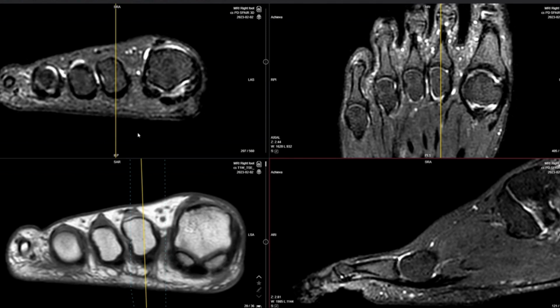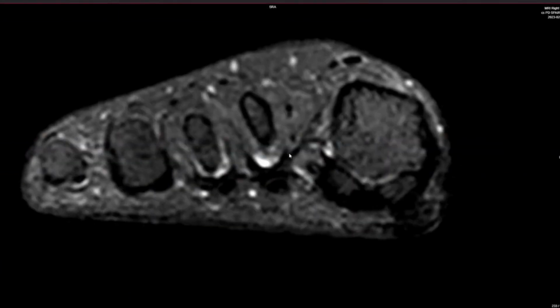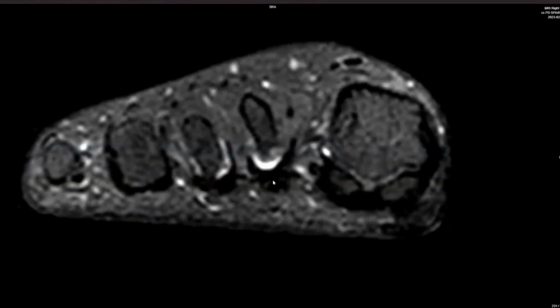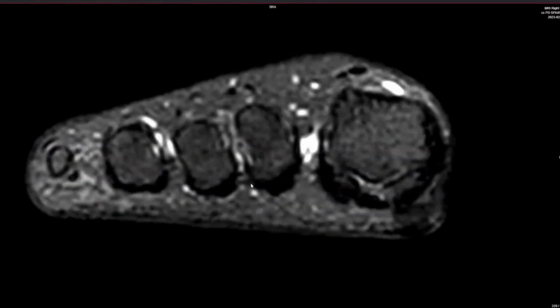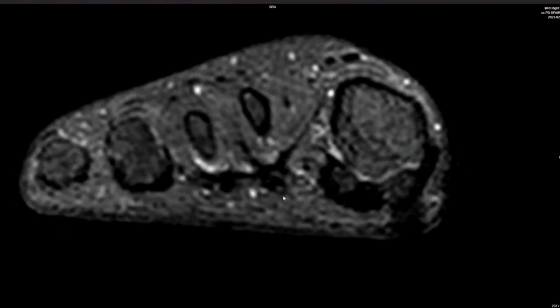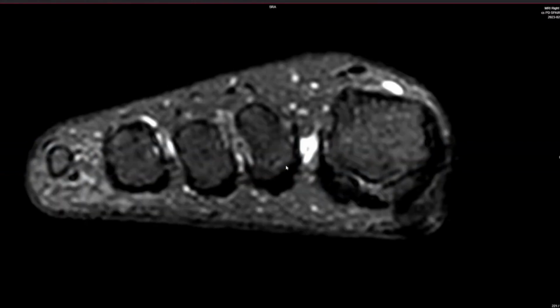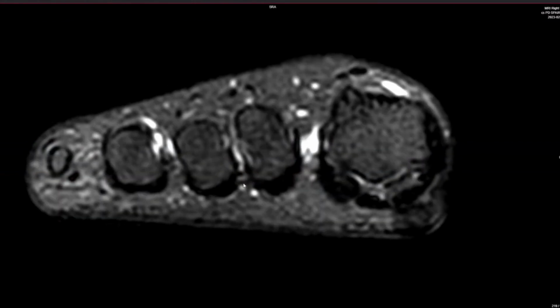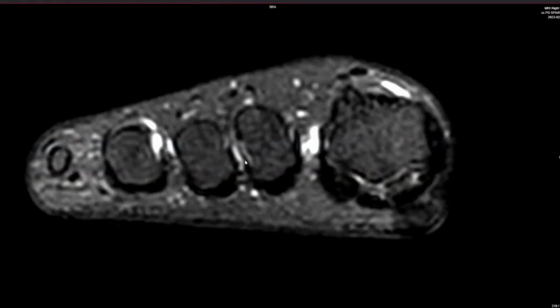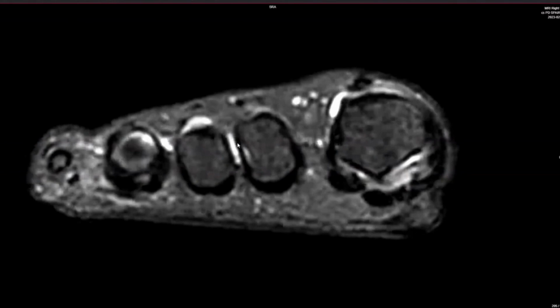Moving to the transaxial image, we can appreciate, moving from proximal to distal, the U-shaped structure of the plantar plate, how it blends into the region of what will form the deep transverse intermetatarsal ligament region. Here's your flexor tendon with its flexor tunnel, and we move into the plantar plate, moving into the region of the metatarsal head. And once we're at the point of the deep transverse intermetatarsal ligament, we can begin to consider the accessory collateral ligaments and the proper collateral ligament.